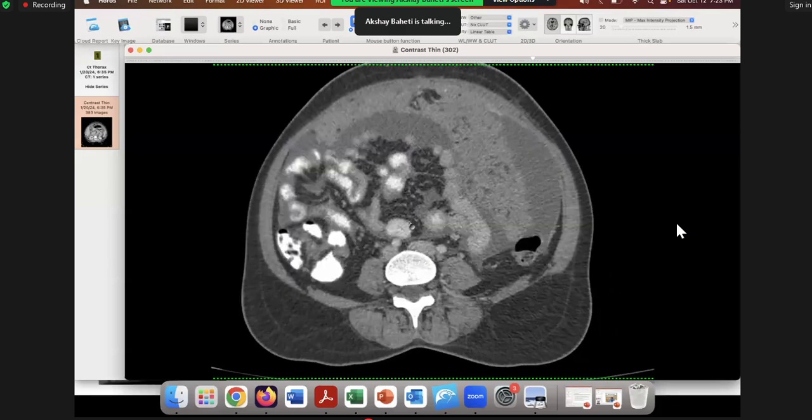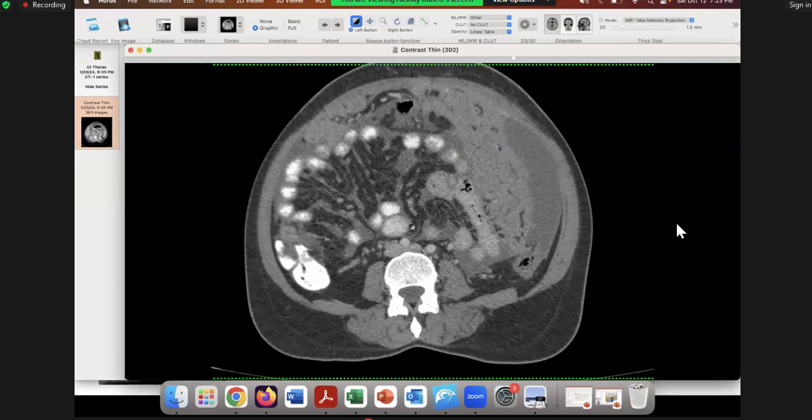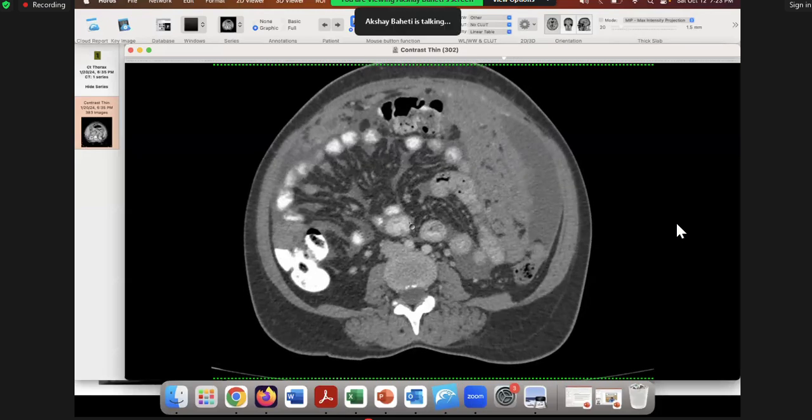Now, what do you think is happening here? Is the mesentery fine here? Let's stop here. What do you think? So now here, let me just trace. This is all omentum. Whatever is anterior to the bowel is omentum. This is peritoneum, and you can see peritoneal thickening here as well. So there is peritoneal disease, there is omental disease. Now their question will be, is there mesenteric disease?